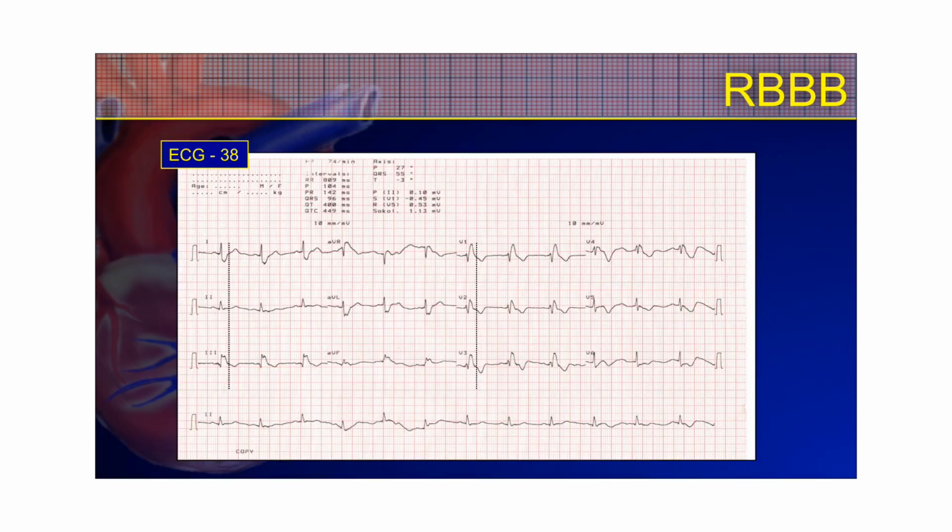So here's an exact example of that very thing. Here's a 12 lead EKG from a right bundle branch block that somebody thought was an acute myocardial infarction, and here's why. They didn't know where the J point was. So they thought in lead 3 that was elevation. And in fact, that's just part of the QRS complex.